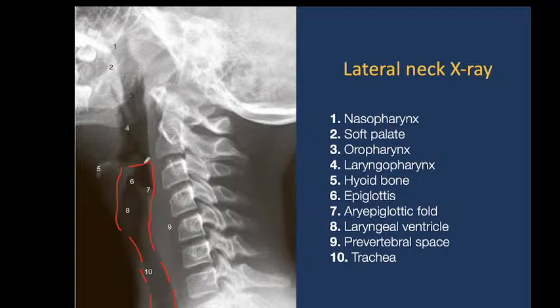These hollow organs containing air inside don't need a special contrasting procedure, some injection, because air also has the minimal radio absorbing feature for X-ray.